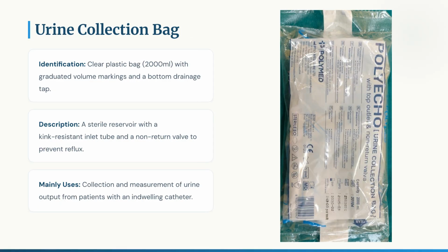The urine collection bag is a sterile reservoir with graduated volume markings. It is used for the collection and measurement of urine output from patients with an indwelling catheter.